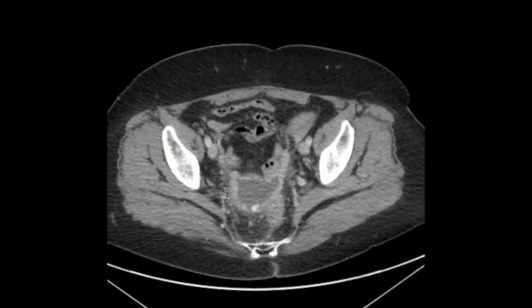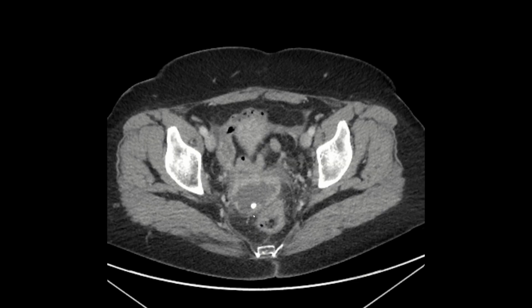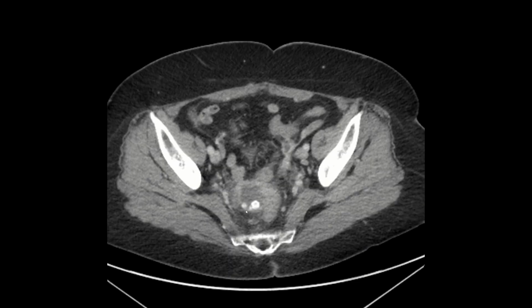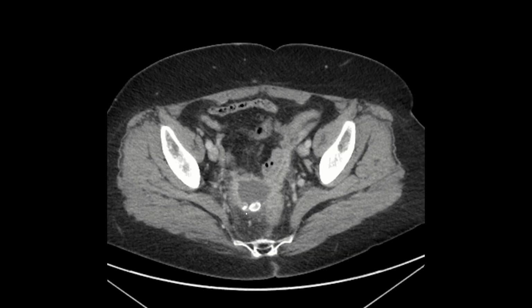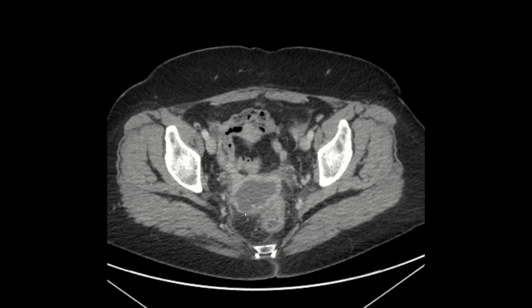Clips in the pelvis, we see this collection right here which has a thick wall with rim enhancement, and at the periphery we see this hyperdensity 2 and 3, and these are appendicoliths which were dropped at the time of laparoscopic appendectomy, and now they're sitting in the dependent portion of the pelvis and they have created this abscess.